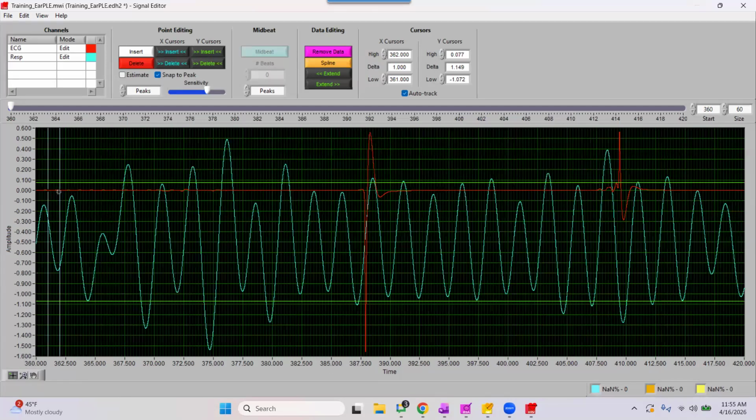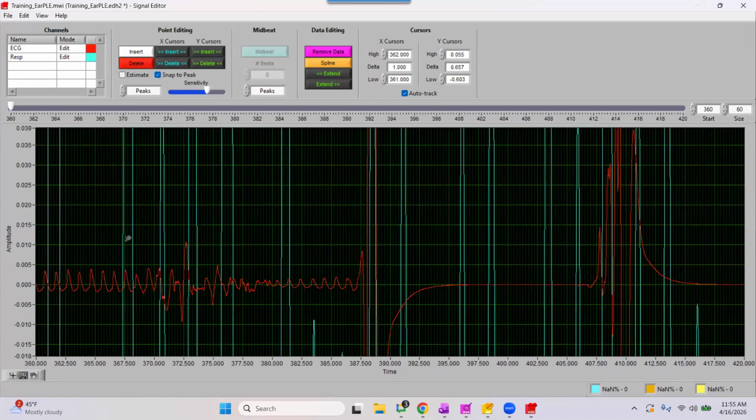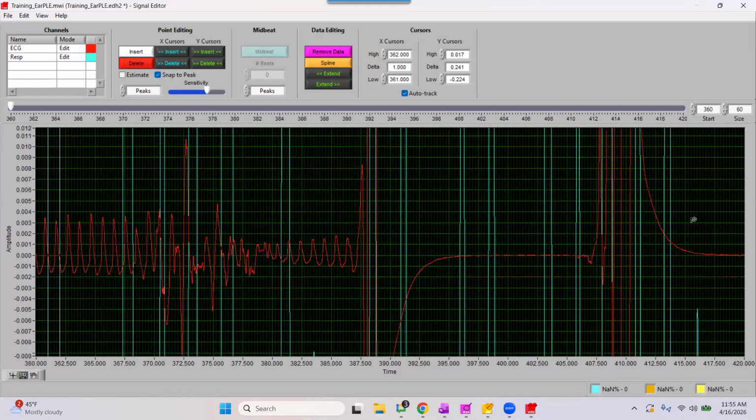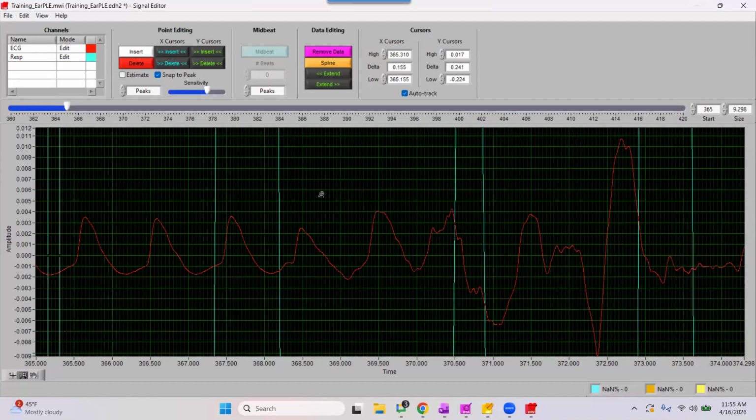movement, but way, way, way under there, I can see these teeny, tiny little blips of what look like pulsatile waveforms. So in order to examine this further, I'm going to zoom in heavily on my y-axis, and this time highlighting just the section around this piece of data. So even though we had this big section of movement, and respiration is getting pretty wonky as I zoom in on my y-axis, what we can see here is that there actually was really good data underneath this all that just got missed, given that drop off in signal.